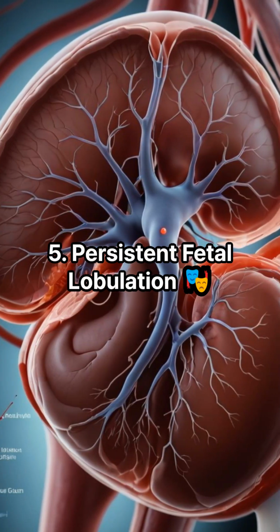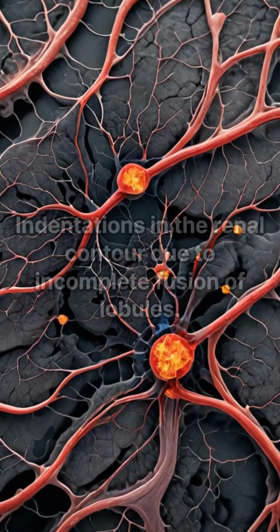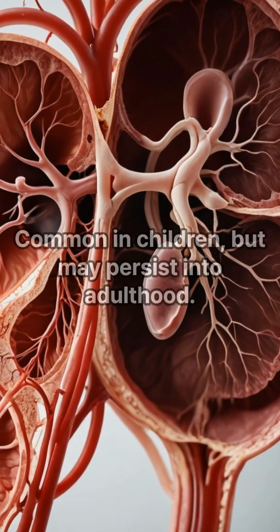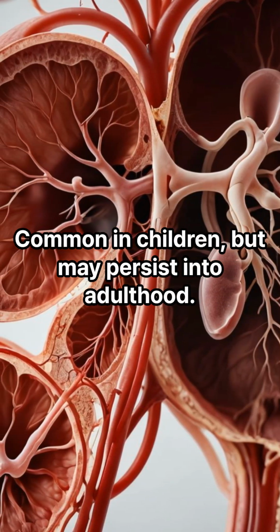5. Persistent fetal lobulation. What is it? Indentations in the renal contour due to incomplete fusion of lobules. Common in children, but may persist into adulthood.